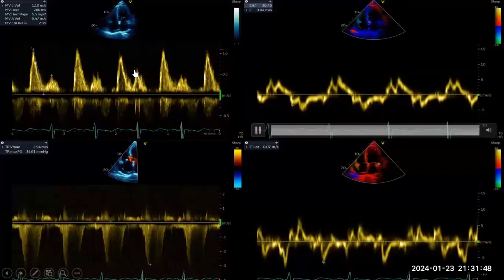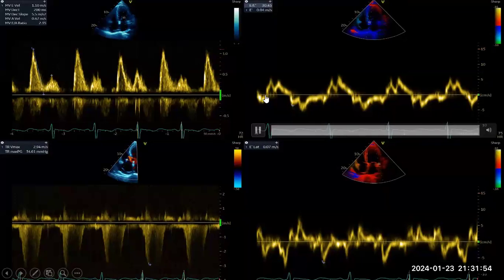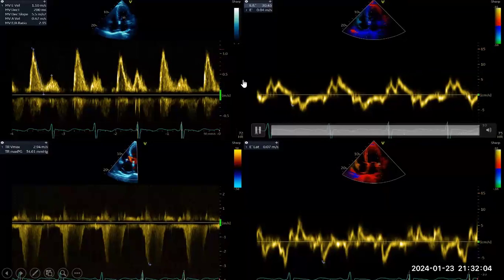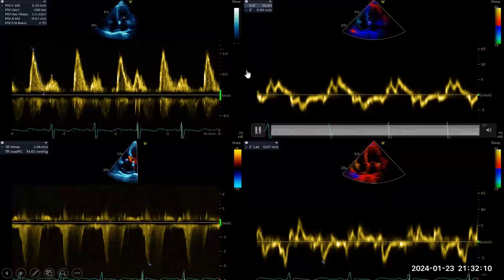Okay, this case, come on guys. Of course, in the OSCE you might face such a case. I'm not sure about the coding, in the cases where there is a coding sheet, but in any station in the OSCE they might start with you by asking what is this? By the diastology, okay?